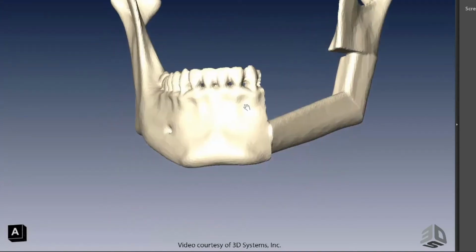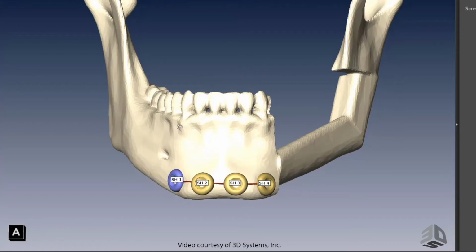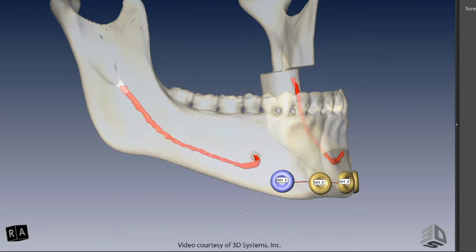Okay, and how many screw holes would you be looking to see on that symphysis segment? So can I have 3 on the symphysis segment, but the other, perfect. Can we see if we can get a 4th one in there, please, actually? Absolutely. The rationale for the 4th one is that sometimes when there's a delay between the planning and the plate arriving in surgery, or if there's a rapidly growing tumour, you need to have in your mind a plan B in case the resection is more than you thought it's going to be. So I always have an extra screw if I can. So 4 is perfect. Okay, and I can show here too that it looks like we've got plenty of room away from that right IA nerve.